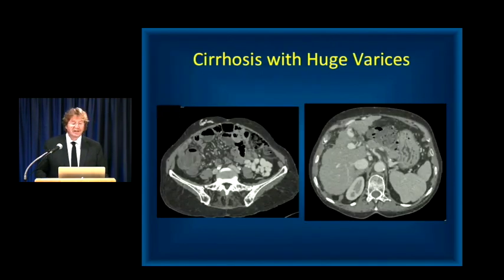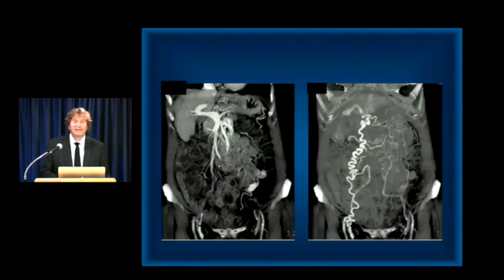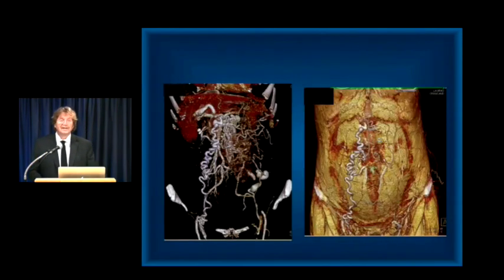Patients with cirrhosis get recanalization of the umbilical vein, as in this case, and you see varices going down and into the abdominal wall, nicely shown here, and then tracking down to the right inguinal zone. The portal vein was patent, but the patient has severe portal hypertension. The patient has severe congestive changes in the liver, and you have recanalization of a dilated umbilical vein with large collateral flow pathways, beautifully seen. So imagine doing a paracentesis for ascites or doing liver biopsy. You want to be very careful and stay away from the vessels.